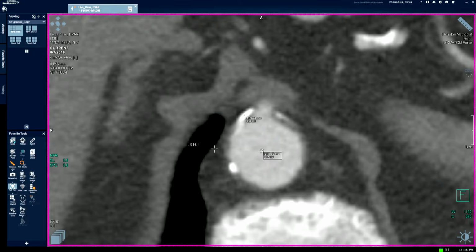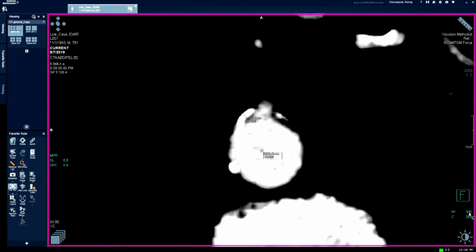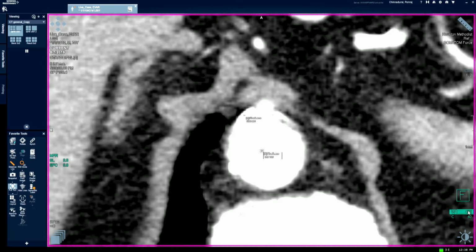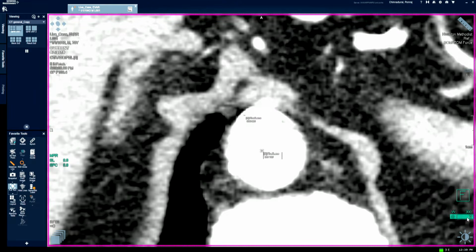So when differentiating the vessel wall and the lumen, we have to have enough width in our window to account for that variation. If I had a center at 0 and a width of 300, both the contrast and the bone have the same pixel density assigned to them, and that's why we are not seeing it better.